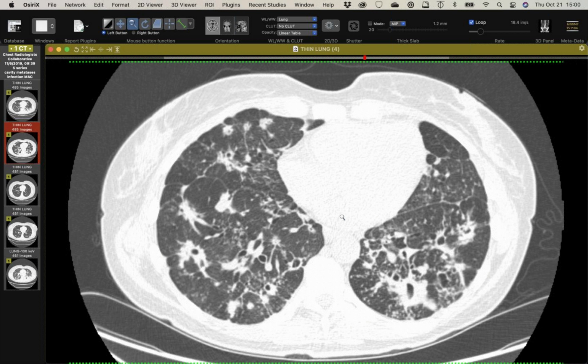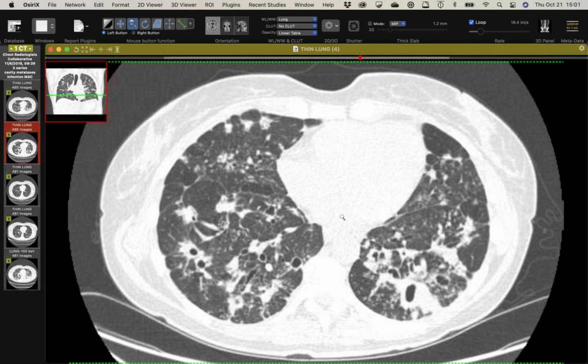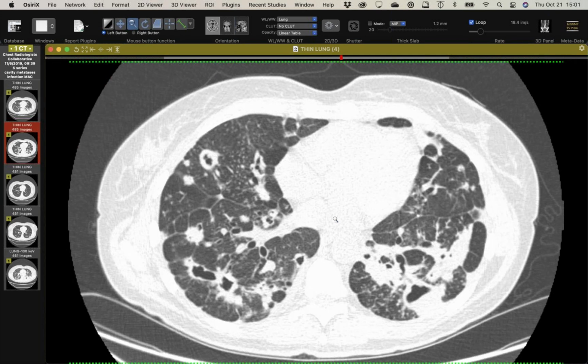Yeah, I wondered that, or if it is just, I mean, she's not acutely ill. She's tolerating her meds, so I didn't know if it was just spillage of debris and bugs, but not really worsening of the infection. I didn't think it was necessarily a worsening infection, or was it just a redistribution of all the exudate? But they're so uniform. Go ahead.